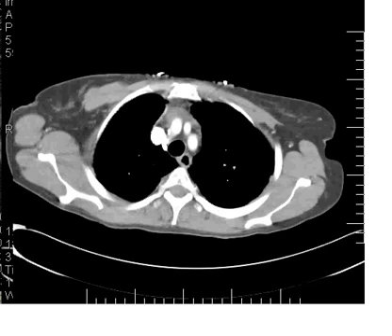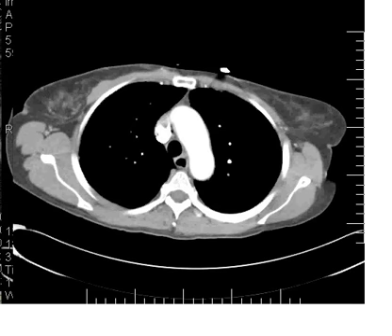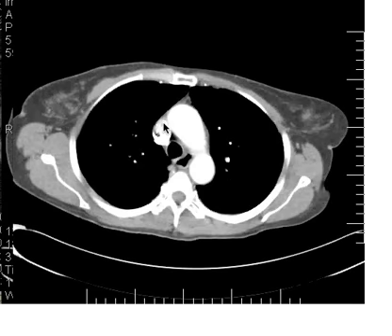And so, when we get down a little bit lower, you see the two of them kind of mixing. So here you have opacified blood and some unopacified blood. Just to get your orientation here, here you see the SVC, here's the aortic arch.